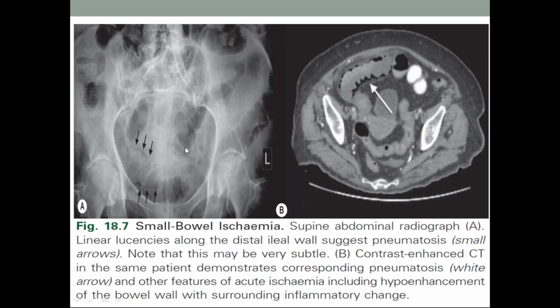This is the condition in a small bowel ischemia case. We can see thin linear gas-type air here and here also. And we will see these are the valvulae conniventes, not haustrations. Haustrations are incomplete, while valvulae conniventes are complete.